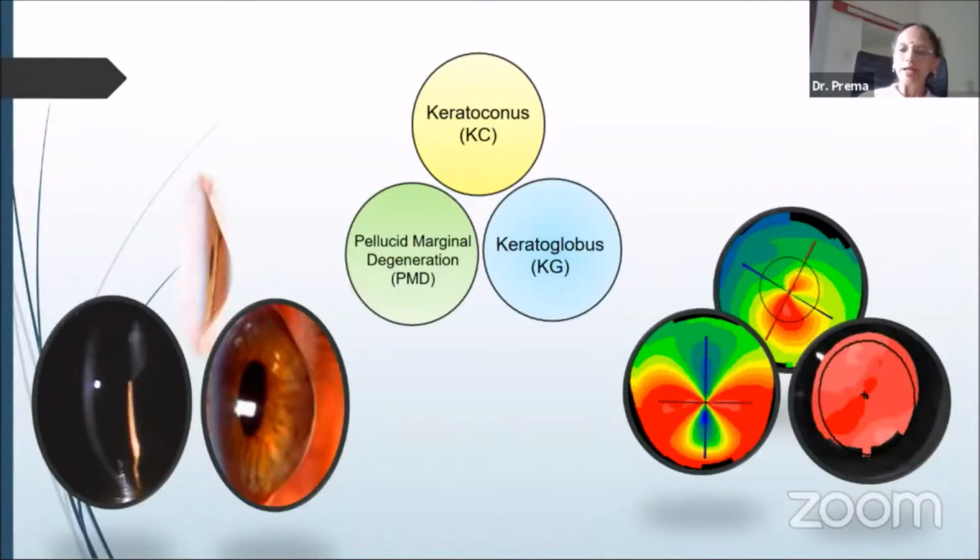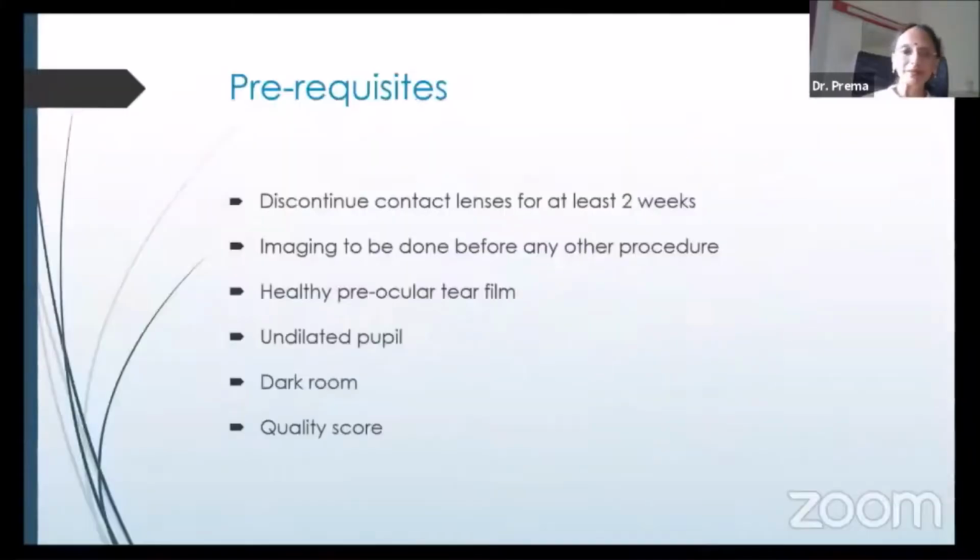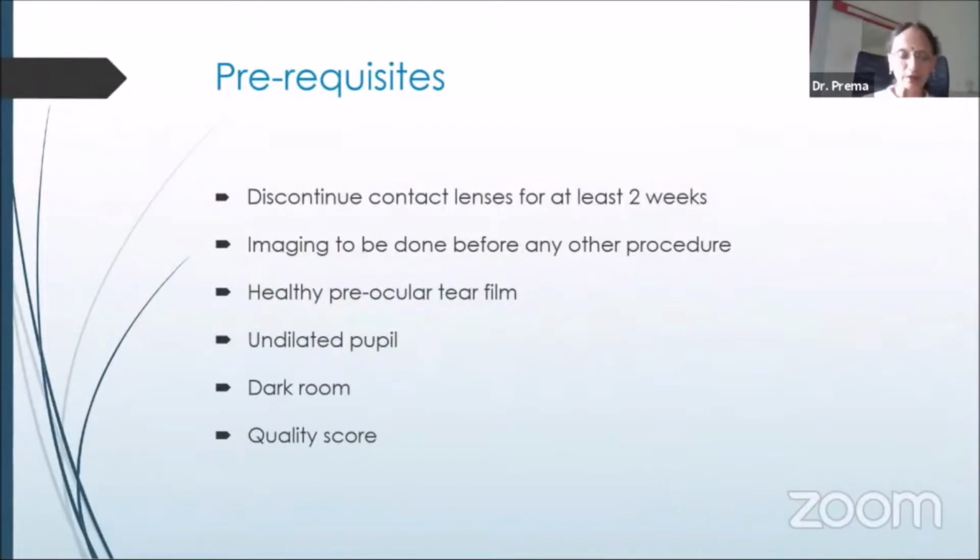So what I would like to do is take you through a few cases where we have found these diagnostic complexities and how we exploited different features of the Pentacam to try and unravel them. I realize that all of us are seasoned Pentacam users, so this slide is really redundant for most of you.